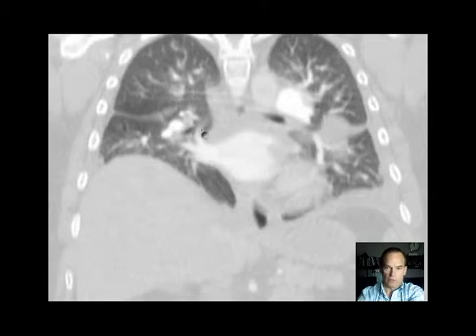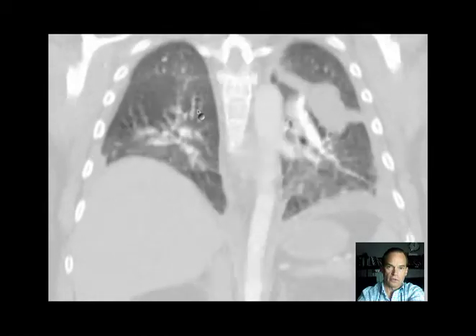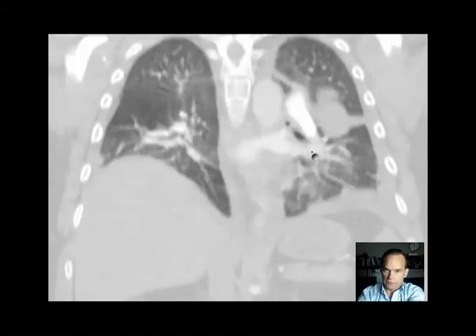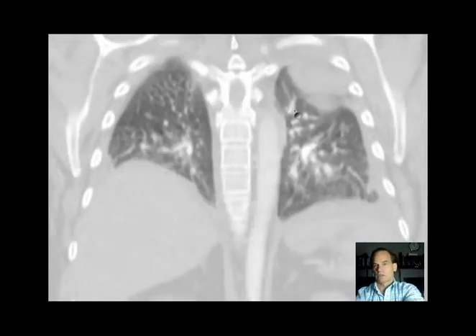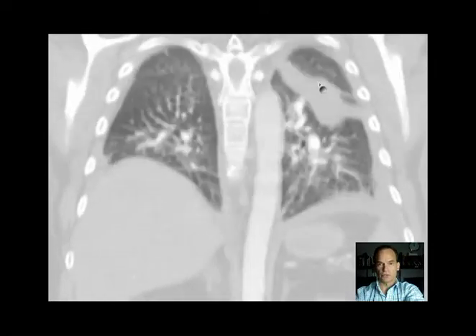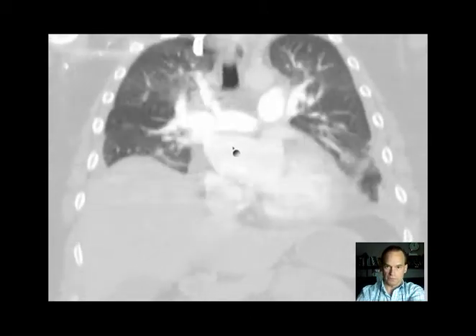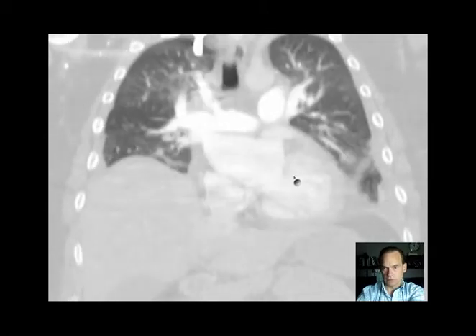So these are pulmonary veins draining into that left atrium from the right lung, and then they'll be coming in also from the left lung here and up here. This is that fluid tracking in the major fissure. Big left atrium, big left ventricle, relatively.